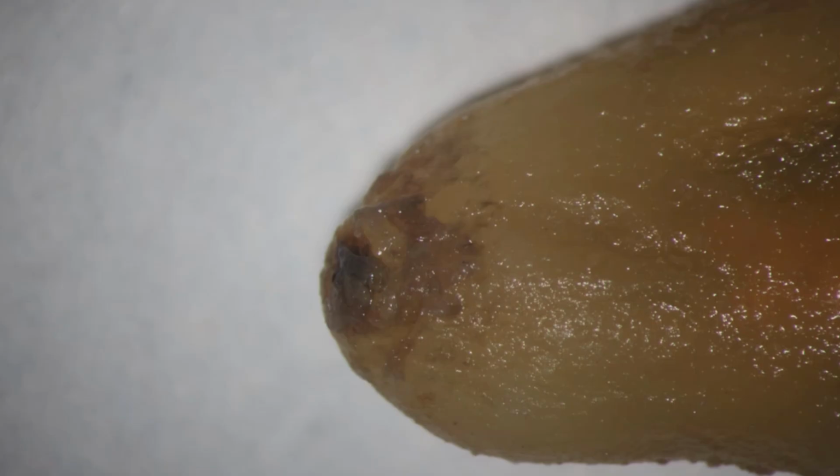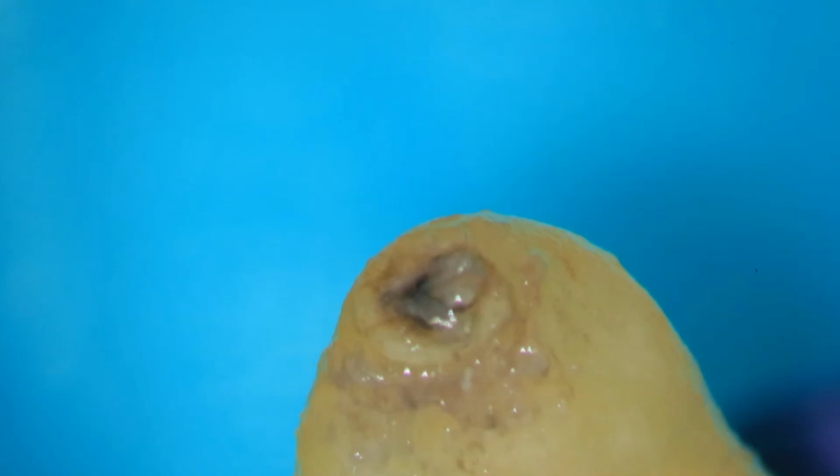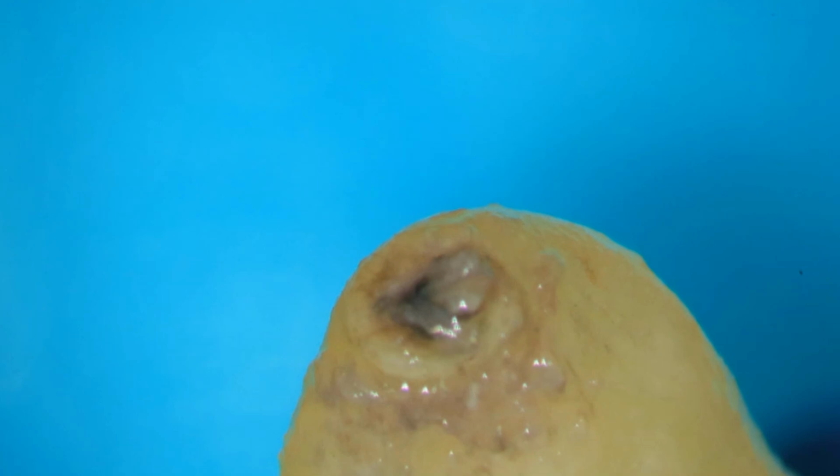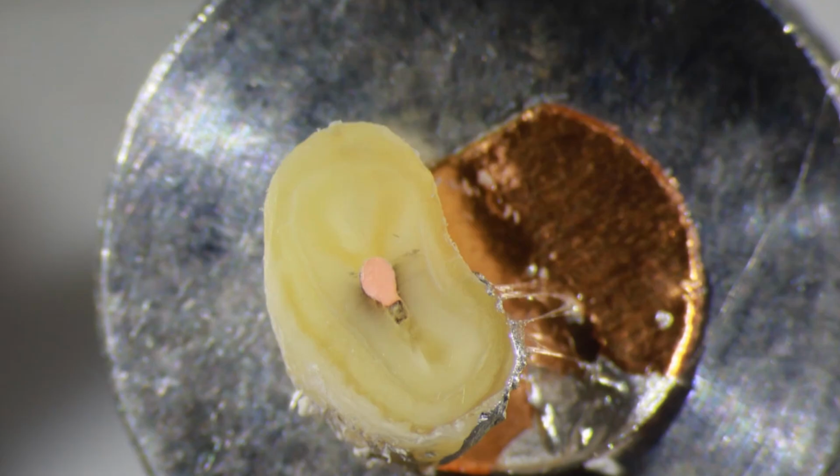Now let's look at the distal root. And here it also looks like there's either an isthmus area or an extension of the distal canal. This is a photograph of what the end of the root looked like. It didn't look like there was much of an abscess there, at least compared to the mesial root, but there was some granulomatous tissue.